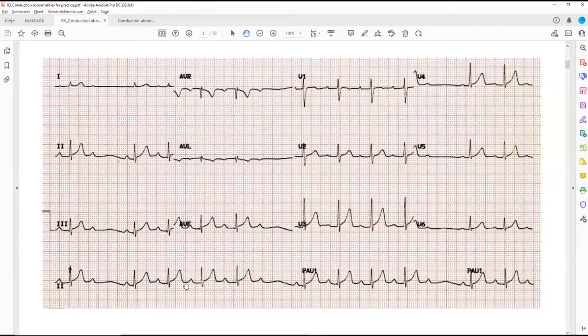But sometimes if you do have a relatively lower conduction, it's very difficult to see the elongation. Here you can count 1, 2, 3, 4, 5. So 5 to 4 conduction occurs here, because we have 5 P waves and only 4 QRS complexes. So 5 to 4 is the conduction ratio.